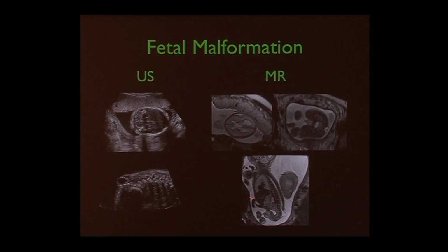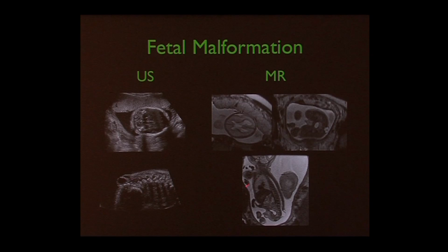And here's a sagittal view with the head up here, and the outpouching is down here, and that's through a defect in the sacrum itself, called the spina bifida, and a meningomyelocele, which is the sac of fluid coming out of the spine, sometimes with nerves in it, is what this is and what that is. All detected while the fetus is still in the mother.